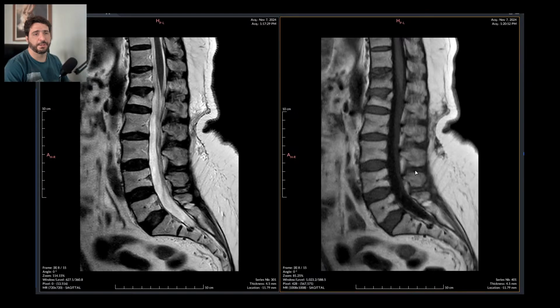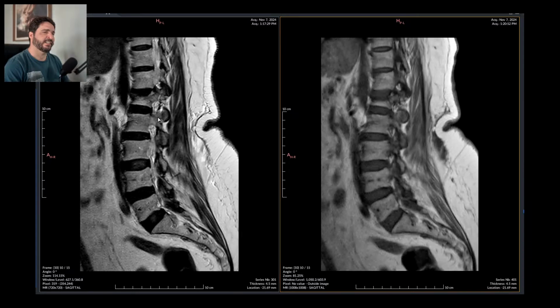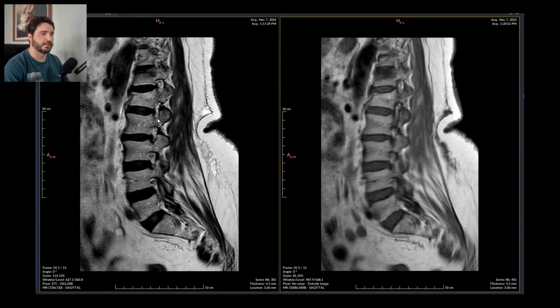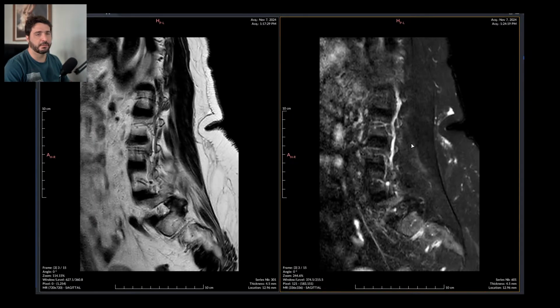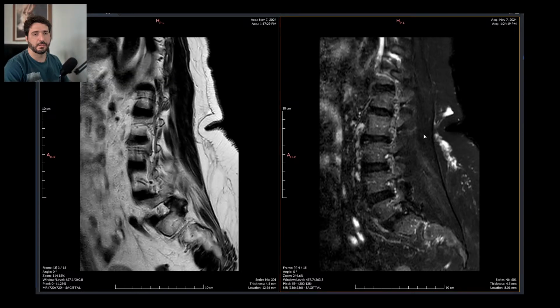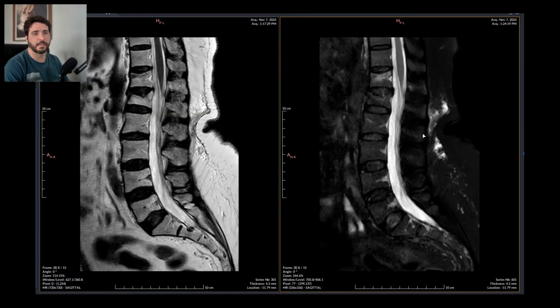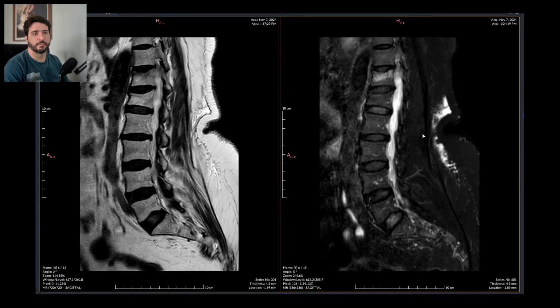A fragile patient that had an acute insufficiency fracture. Did the fracture reach the pedicles? Can't really tell because resolution is awful.